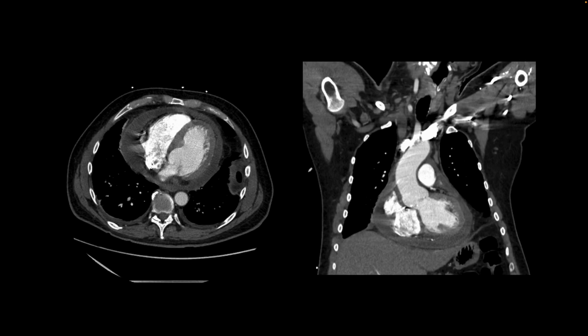Here's our next patient, and the finding on this CT of the chest in soft tissue windows is pericardial effusion. Here is the fluid which is around the heart, and the pericardium itself is thick and it shows enhancement, so you should also raise the suspicion that there may be superimposed infection. The other sign of infection is if there are foci of air or gas inside this fluid.